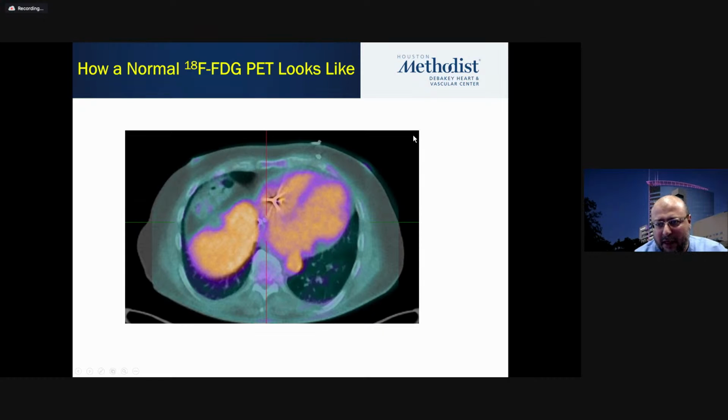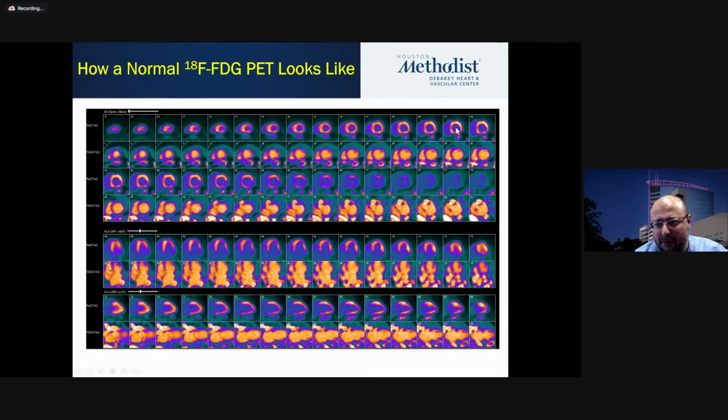On other traditional displays, you see a blood pool which is empty on perfusion imaging, where there is no rubidium or radioactive material, and on the FDG images, you see all the blood pooling there.